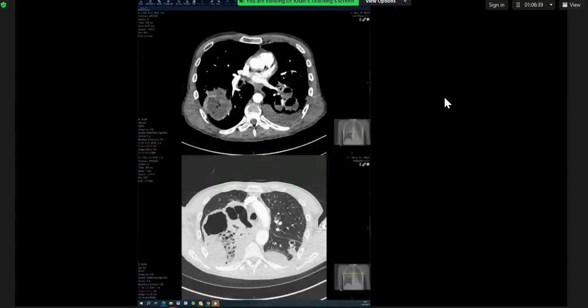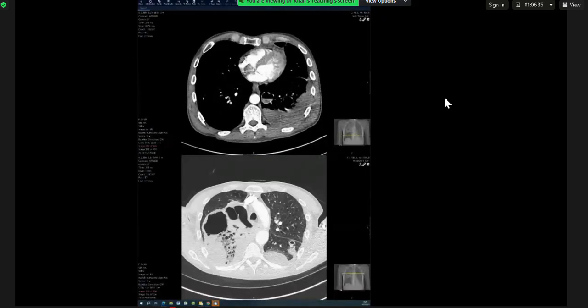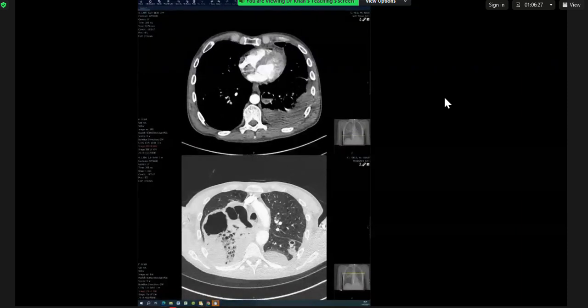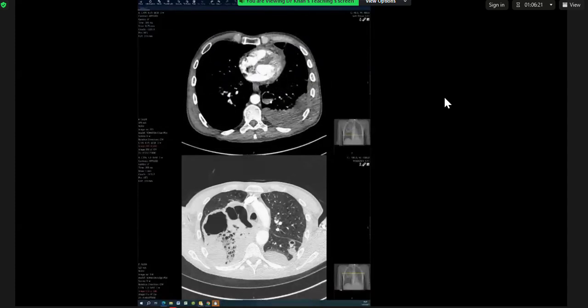Maybe necrotizing pneumonia. Anything else in the lung, in the CT? I can see that there is opacity in the left lung, that one that you were scrolling over. I just want to exclude that there is any communication with the abdominal cavity.